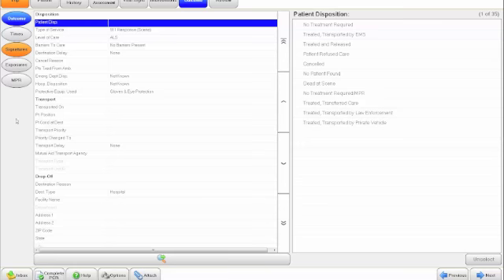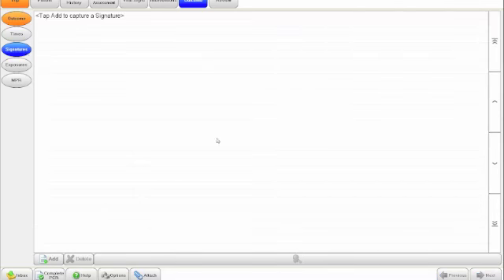Now with the MPR button, what it allows us to do is get a signature for one of the patients on the scene and fill out this individual patient care report, all these different buttons, with our one patient on scene. Most likely it's going to be the patient complaining of an injury. If you have no complaints of any injuries on scene and you have 4 patients who qualify for an MPR, you still need to do at least one of the reports or fill out one of these tablet PCR reports with the information up here.